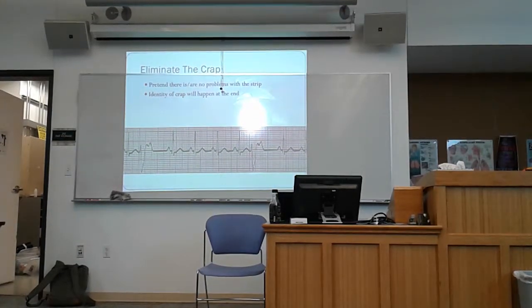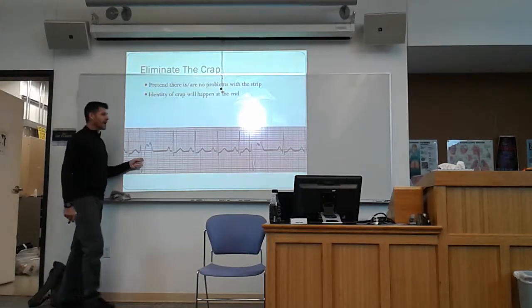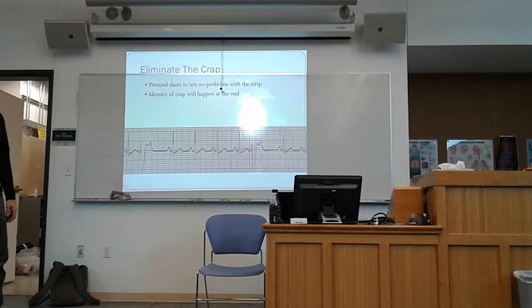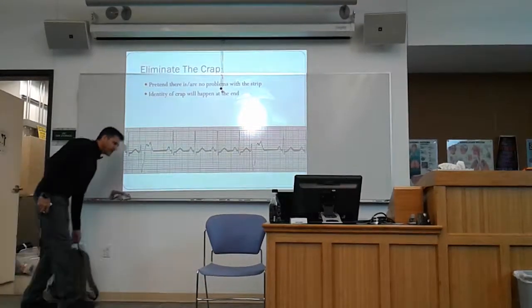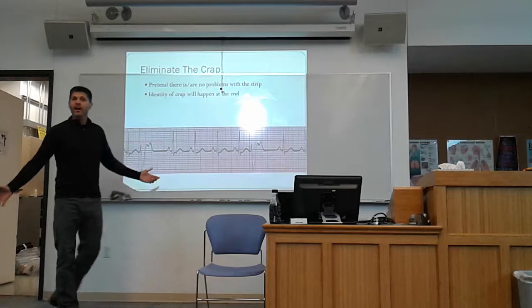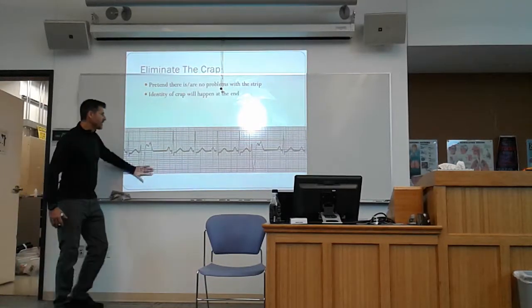The PVCs. Big down things. The big down things. That's exactly right, and that's exactly what I would call them. These big down things need to be eliminated because it's different. It's not the same as everything else. Whether or not those are PVCs, whether or not those are aberrantly conducted PACs, whether or not those are aberrantly conducted PJCs, we don't know. We don't know what those are yet. But we don't care what they are because we don't even know what the rhythm is yet. So we get rid of those areas.